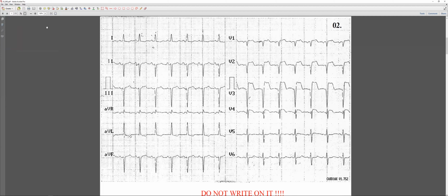Well, it means that we have a problem with our left ventricle. What is the problem with V5, V6? You said it should be positive, and that is not positive. It's because of the axis. No, nothing to do with the axis.